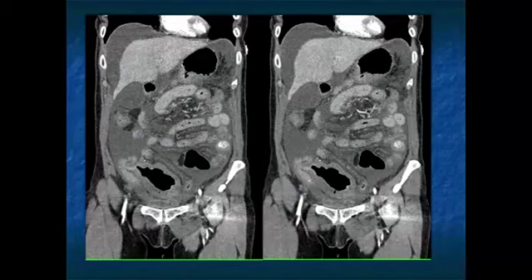You can think about Crohn's disease, but usually it's longer segments and it's not distended like that. It tends to be narrowing and an infiltrative process. Of course, you can have adenocarcinoma in Crohn's disease, and then it looks bulky, but here it looks like something that's thickening the wall of the bowel, but also dilating the wall of the bowel, and this is very nicely shown on these images. And so my thought would be tumor. Could it be an adenocarcinoma? That's a possibility, but you might see nodes, and it's also not obstructing.